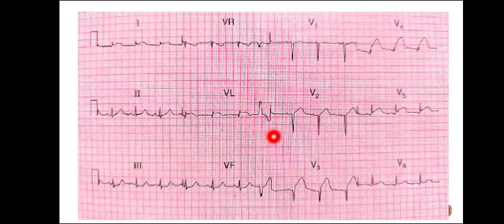Another important thing that I wanted you people to pick up, though it is not that significant, is an ugly looking QRS complex. This is an extrasystole, and you can see the morphology of this QRS complex is very different from the rest of the QRS complexes present in the lead. So this is a PVC. So this is the end of the ECGs.